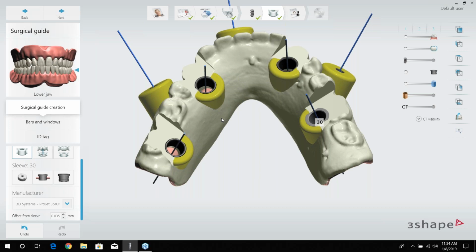And on that note, if there's a system that's not in 3Shape, it's not something where, like if you're familiar with Dental System, you can call the manufacturer, they give you a DME and you put it in the control panel. Anything in Implant Studio has to be added by 3Shape in a software update. So if you don't see a library or an implant system that you need, then you would want to contact that manufacturer and suggest that they work with 3Shape to get their implants in the system. It may be something they're already working on or didn't cross their radar, but now it's there.